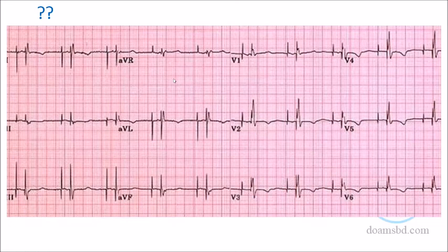What is this? Nowadays, people have pacemakers, so we should never forget it. We are following a patient in the chamber or in the hospital bed, a patient having a pacemaker. If an ECG is shown to us, we will be puzzled if we don't know. Though the ECG is normal as the patient has a pacemaker and is okay in the heart, we are confused. This may be abnormal, this may be abnormal.